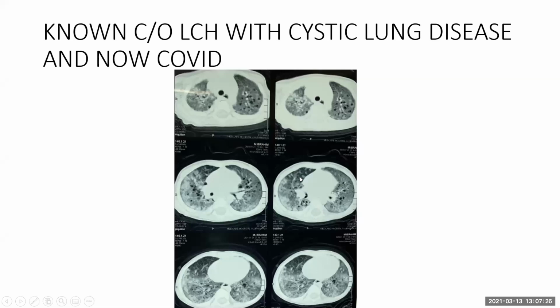I've seen them. They usually occur in the apical regions, right? Yeah. And then these opacities won't be there. They usually are in the apical regions, and they are usually medially placed. And I haven't seen them interspaced, uniform in size, and involving the whole of the lung.